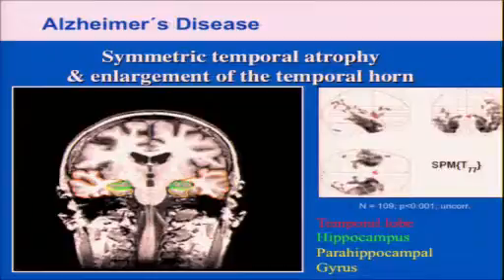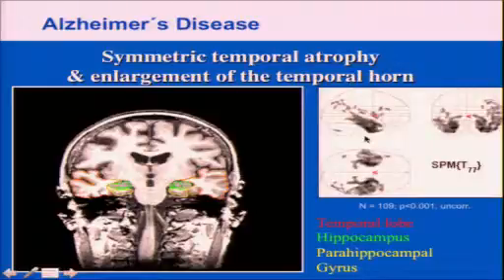And this can be done not only for an individual, it can also be compared with cohort studies, where you have a larger group of normal subjects scanned on the same scanner. You can normalize the individual data onto a larger database and then compare; SPM is one tool that is used for that. And then you can see here, in Alzheimer's disease patients, that the volume loss actually follows the amyloid plaque deposition.